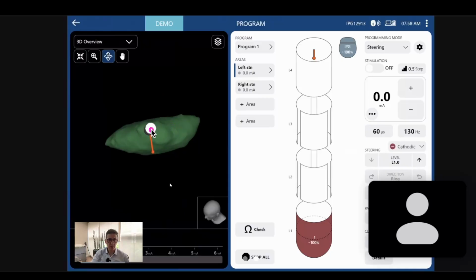But in this patient, the electrode is here. So if I see this in my clinic, I say, okay, I'm going to stimulate this patient maybe with this contact and this one, and I try to put this VTA toward this region. And probably the patient will improve a lot, as really happened with this patient.